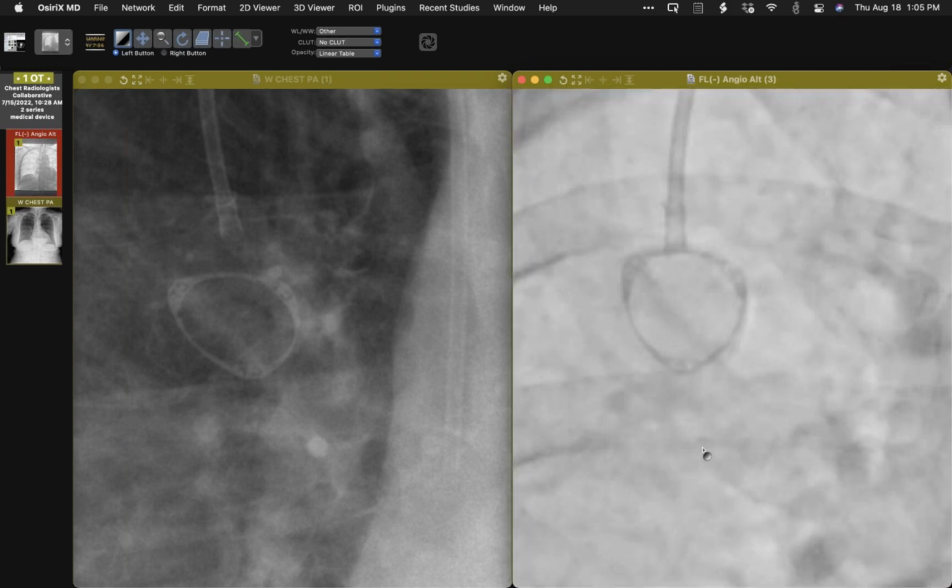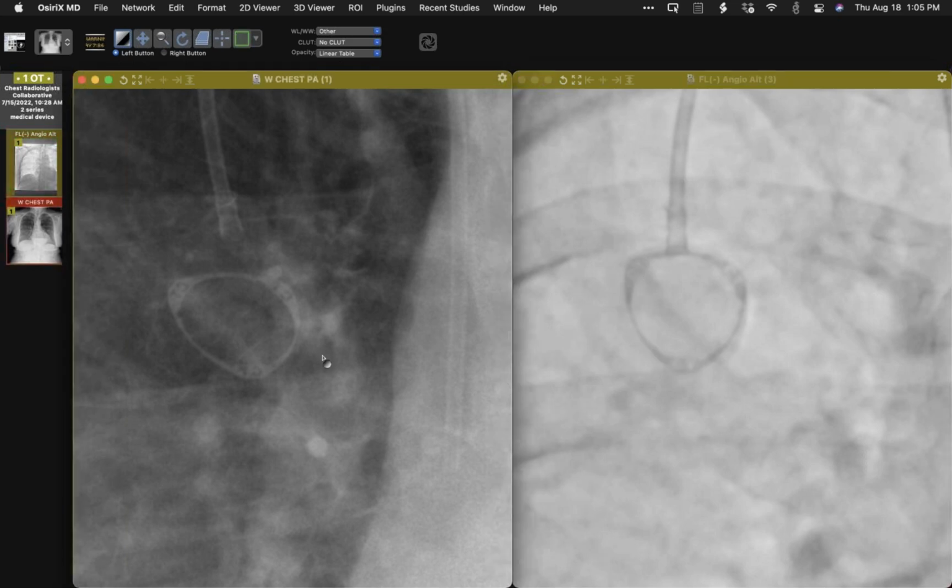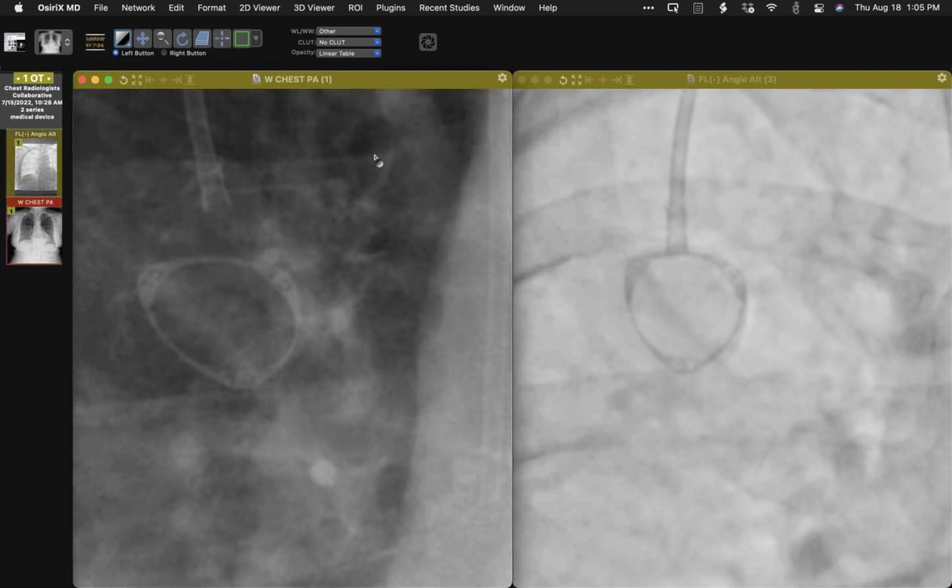And now when you zoom up further, which I will do, I'm going to try and change the contrast. In zooming it up quite a bit, I've actually changed it such that it's going to be a bit hard. And of course, white, black, black, white has changed. But previously, it says CT, CT, CT. And when you look at that now, you can see that the C and the T are now backwards. So it's upside down, CT.